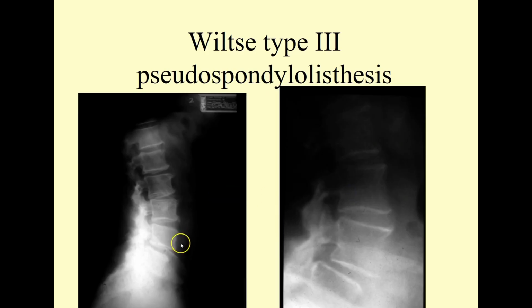Here we have an example, the same patient, just a close-up image, and you can see that in this case, presumably we are looking at L5, and here we have L4 in an anterior position. This is the reference vertebra, so anterior listhesis of L4 versus L5. We would report this by the percentage method: we measure the entire length of this end plate, then take the pedicle-body junction, drop it down perpendicular, measure this distance, and then divide the small number into the big number, and we'll get the percentage. I would estimate this to be about 15% anterior listhesis.